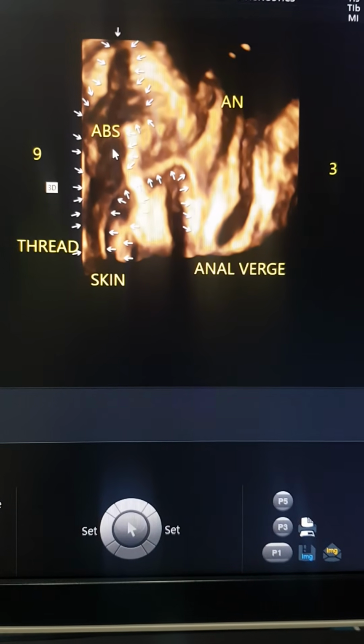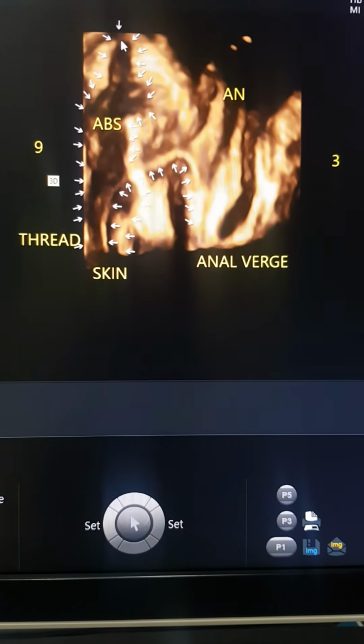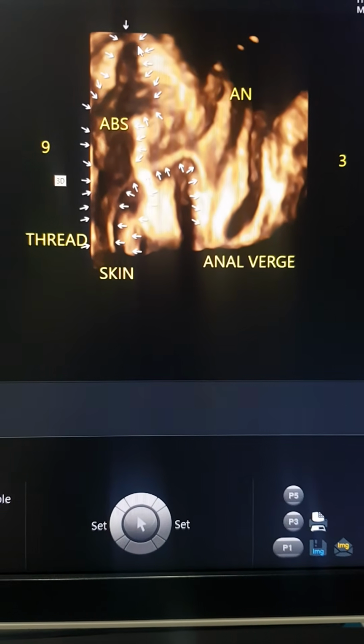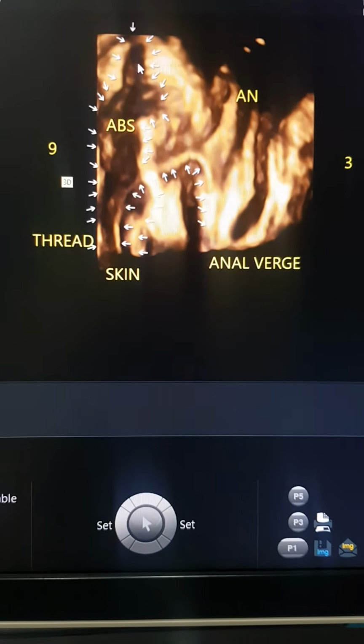That's the vertically oriented tract and ischioanal abscess at 9 o'clock going parallel to the anal canal all the way high up to the levator ani. It stops there. You can see the convex margin, so there is no supralevator extension.